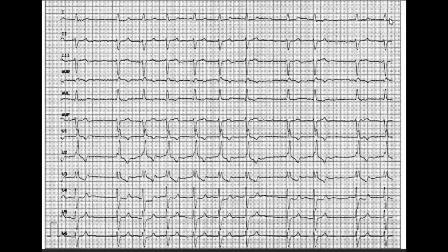So, we already know that the action is irregular. It's not sinus rhythm. Frequency is maybe too low for atrial fibrillation, but as you can see, there are no regular P waves. So you immediately suspect atrial fibrillation. Action is irregular: atrial fibrillation. And I don't know if we see any P waves that we can calculate, maybe here. The frequency of the P waves is 500 beats per minute. So it's quite fast actually.